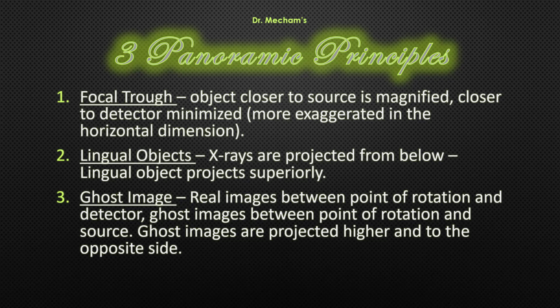But you do need to recognize anatomy, so next we'll talk about different parts of anatomy that you need to understand and label and identify on any panoramic radiograph.